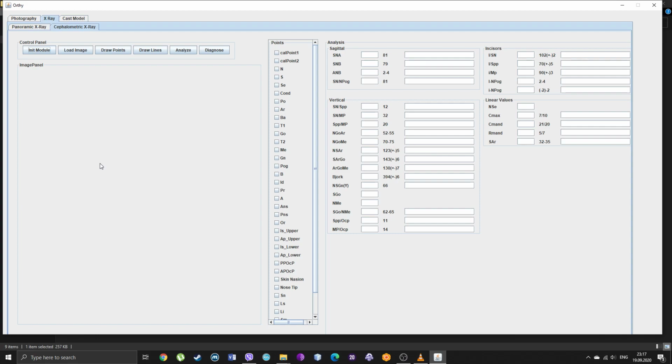If you click this and then this button, the program will just crash. I made this program just for me. I know how it works, and I know when it's going to break, so just follow the steps and everything will be fine.